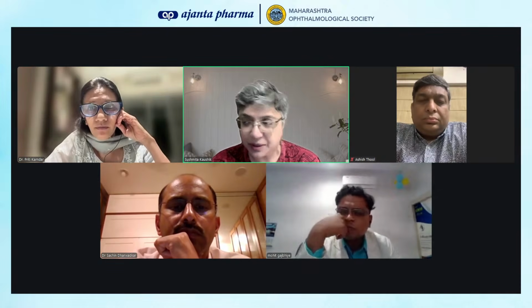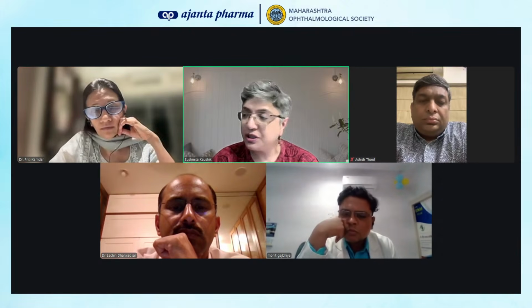And the other thing to keep in mind, especially for using the progression analysis, which might become a limitation for us, is that if you have a high volume practice, the progression analysis on the OCT requires all examinations to be in the machine. And usually, if you're using the Forum, the OCT pictures go straight to the server and then to the Forum to you.